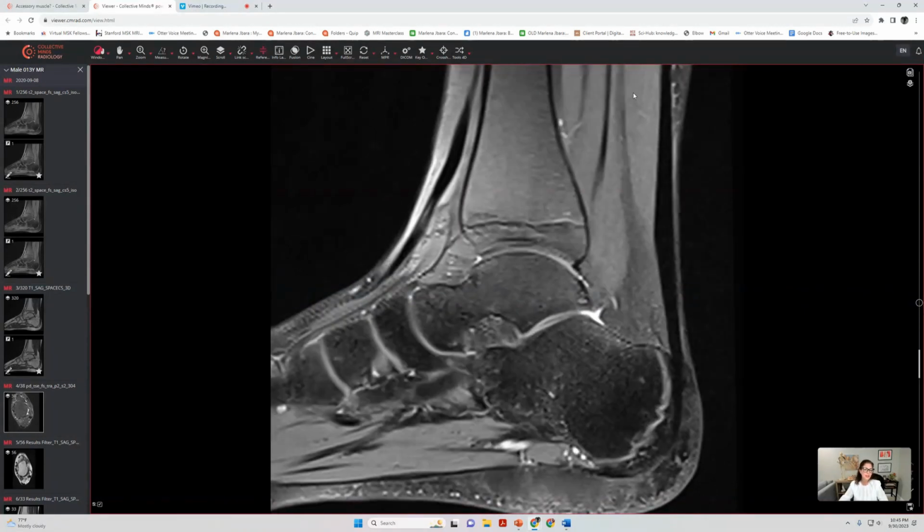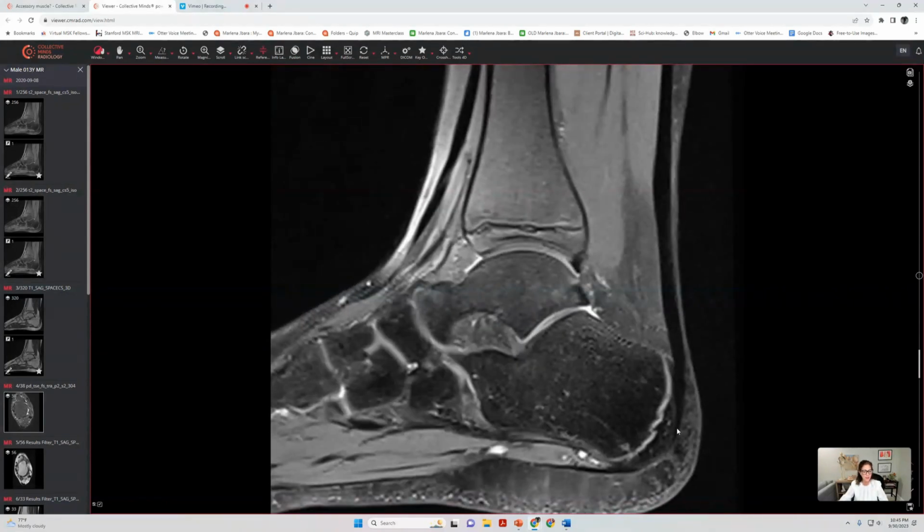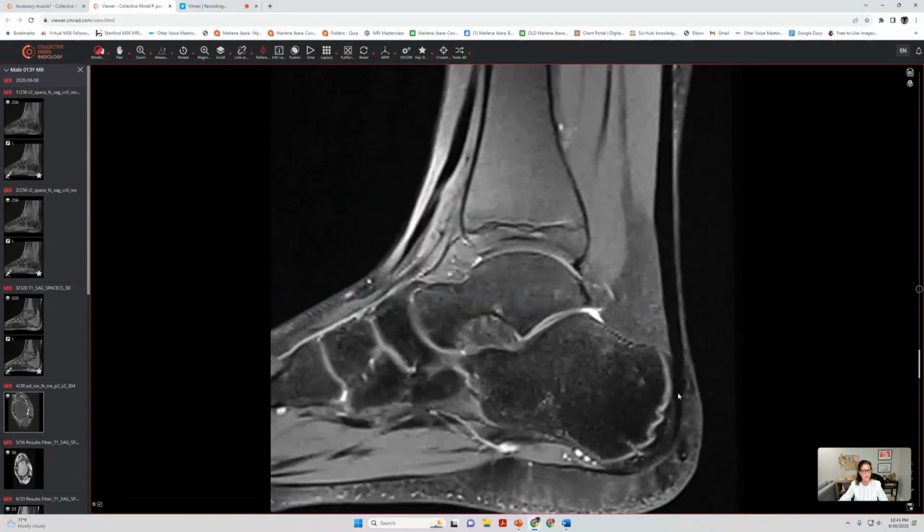We can appreciate the soleus muscle as it attaches to the Achilles tendon above the level of the tibiotalar articulation. If it's below the level, it's considered a low-lying soleus muscle. The Achilles tendon, furthermore, has a long insertion onto the posterior calcaneal process. We'll be searching for retrocalcaneal and retrotendon bursitis.